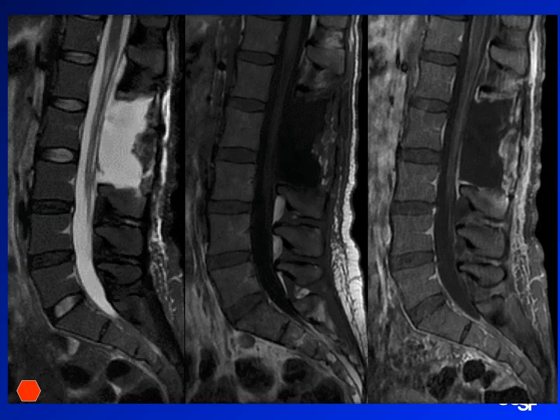But I think you're on the right track. How would you describe this? What do you think is going on there? It's like a big fluid collection. Exactly, it's a big fluid collection, and in the post-surgical setting, what can a big post-surgical fluid collection be? Hematoma, abscess, just a seroma, like a resolving, liquefying hematoma or whatever.